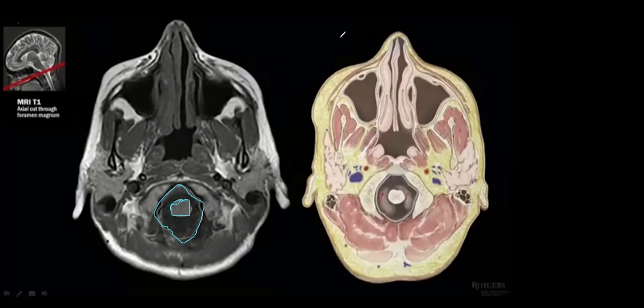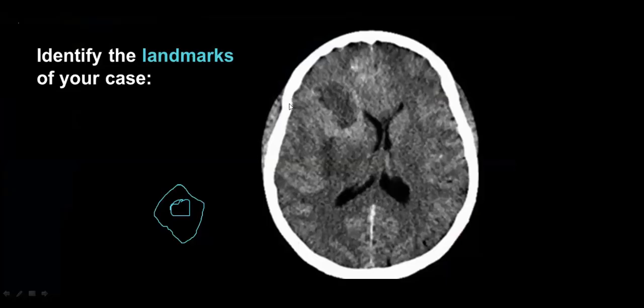The medulla oblongata or spinal cord? Spinal cord, sir. Why not medulla oblongata? Sorry, sir, lowest part of medulla oblongata. Very good. Lowest part of the medulla. This is not the spinal cord. When you are at the level of C1, then you can say it could be the spinal cord.